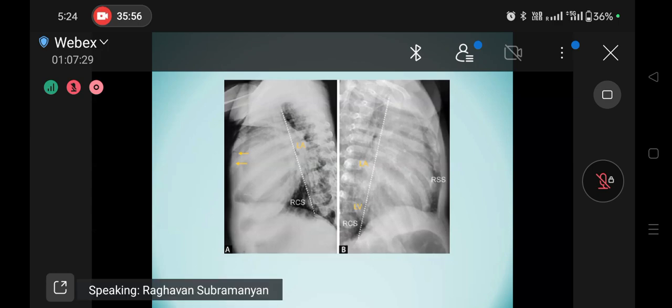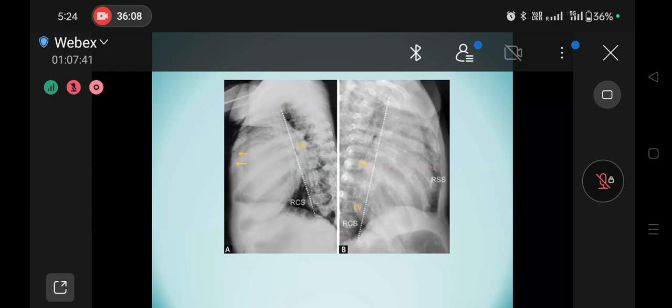Please, the examiner will always ask you, is the right ventricle enlarged? And invariably, students will say yes or no or maybe whatever it is. Your answer should be that the right ventricle does not appear in the border in a frontal chest X-ray. Frontal means both the anteroposterior and posteroanterior views. For right ventricular enlargement, you need a lateral X-ray to look at the retrosternal space.